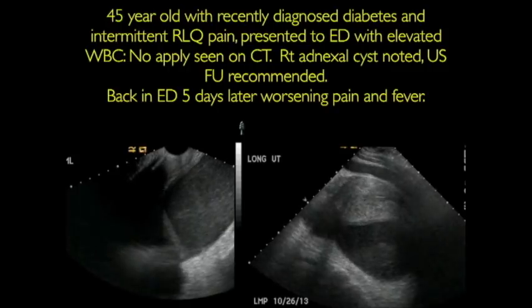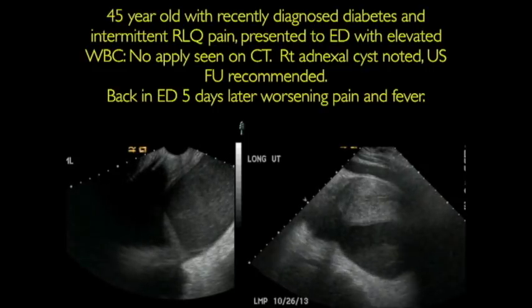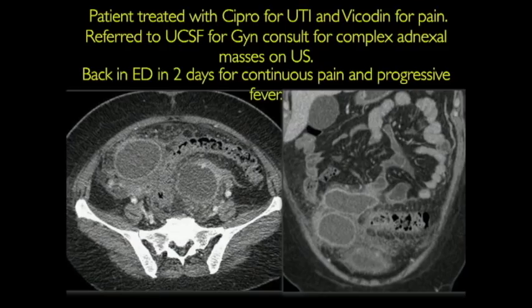So the patient had a follow-up ultrasound. It looked kind of funky, they weren't sure what it was, and they said, well, let's send it to UCSF for a GYN consult. There was a delay in getting the appointment. So the patient again came back to the emergency room, and now we got another repeat CT, and you could see that there is really rip-roaring infection. Now it's involving the adjacent bowel and everything. So this is a subtle pickup on the CT, not to miss a tubo-ovarian abscess.